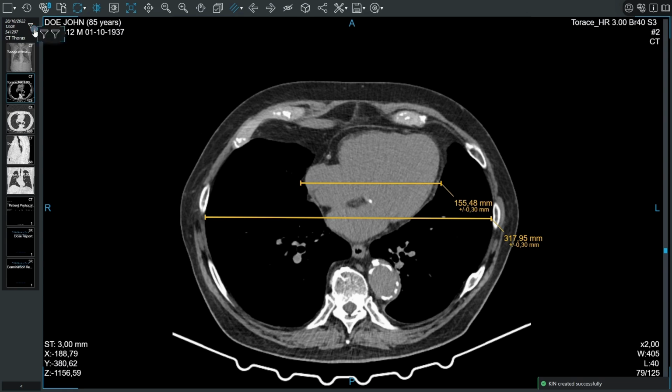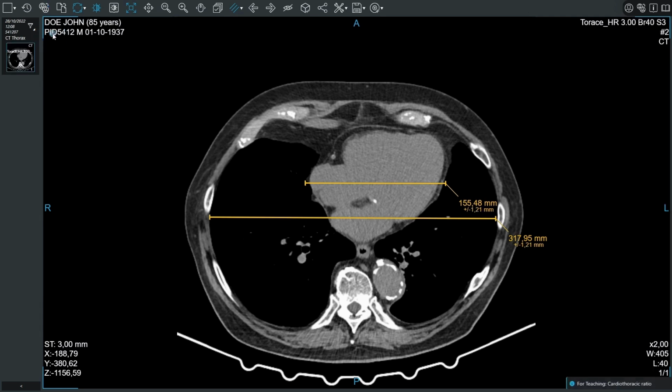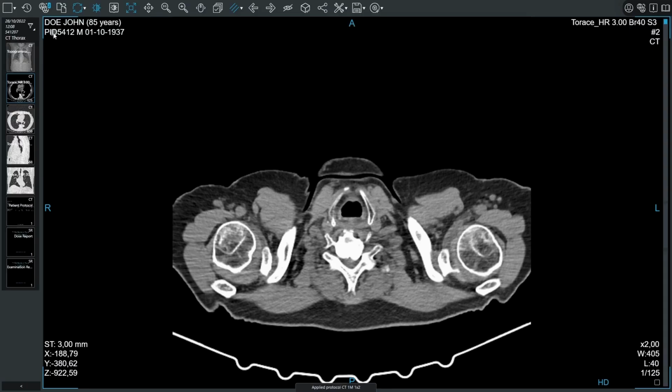Once created, the KOS can be displayed by clicking the funnel icon in the top right corner of the preview bar. If multiple icons are present, the desired one can be identified by hovering the mouse over each icon to view the KOS details. Clicking the icon again will display the entire exam.